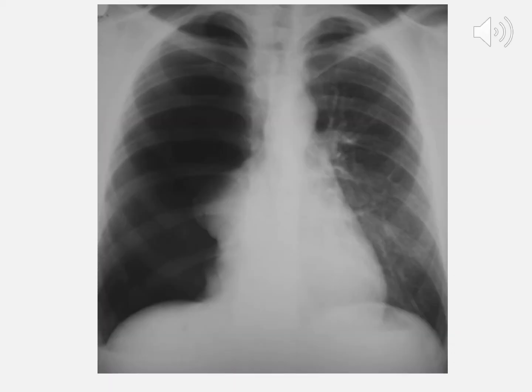Here's another one. Can you see it? You can't really see the border, but you can look at that right lung, which is on the left side of your screen. The right lung has no lung markings. You can see just around the area of the right atrium. It looks like a deflated balloon, which is what this is. This is a complete pneumothorax, the beginning of a tension pneumothorax, which we'll get into in a minute.